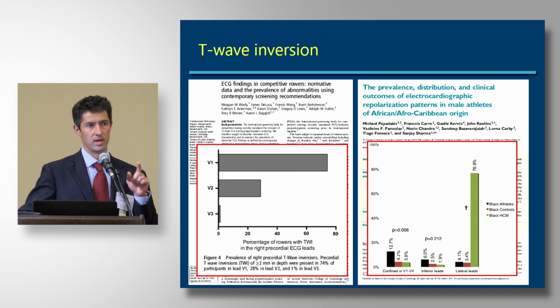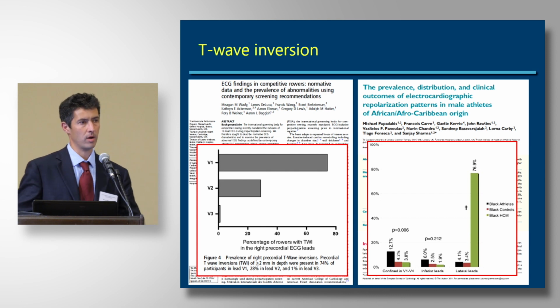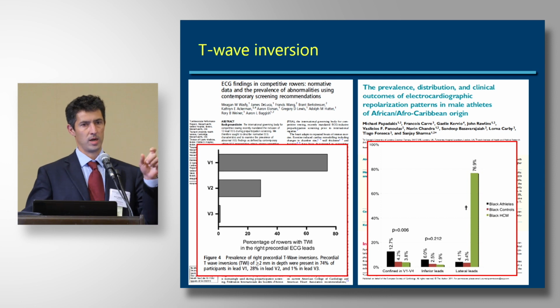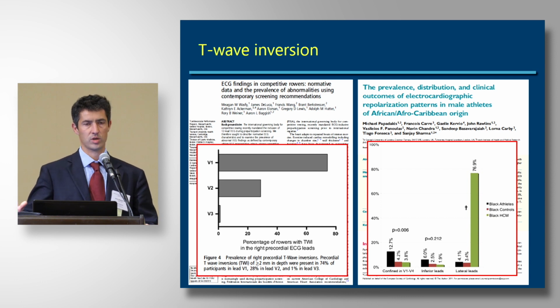And remember that T waves and QRS vectors are concordant. So if the net QRS vector is down, the net T wave vector should be down. So when we talk about where T wave should go from being down to up, instead of focusing on leads, I would encourage you to also focus on this issue of RS transition, which unfortunately wasn't captured in this document.